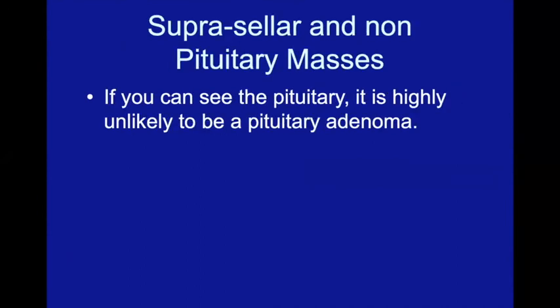Now, for suprasellar and non-pituitary masses, I'm going to show you a few examples of this. If you don't learn anything else today, I think this is important to be aware of, because this will come up in your practice from time to time, and you can make a significant contribution to the care of the patient, because for these non-pituitary tumors, the transsphenoidal approach may not be the appropriate surgical approach.